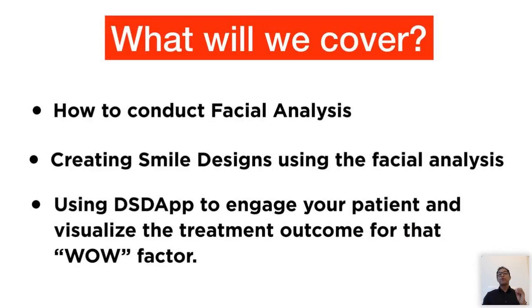So what we will cover today: we will cover how to conduct facial analysis. We will be creating smile designs using this facial analysis, and then I will show you how to use DSDApp to engage your patients and visualize the treatment outcome for that wow factor.